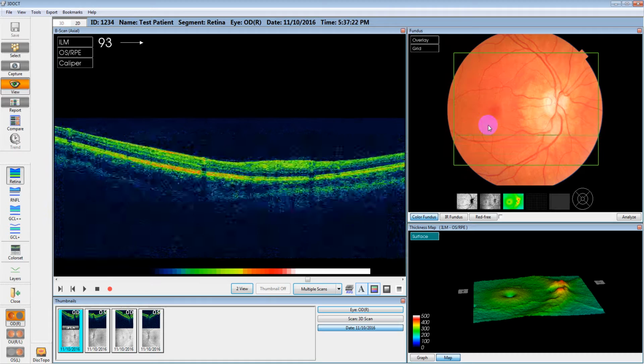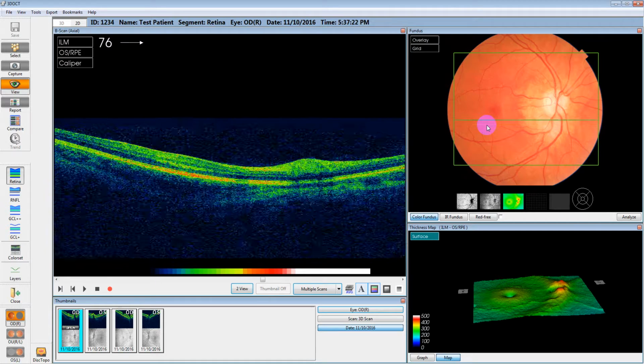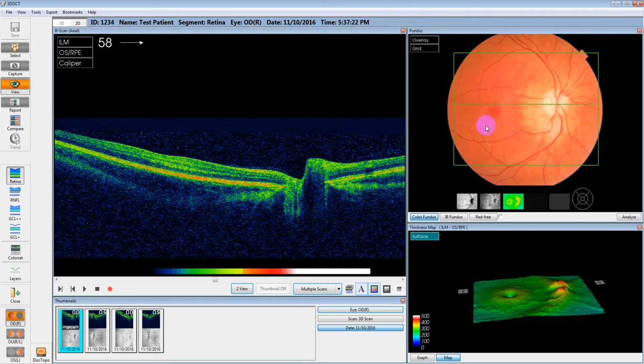Now, on this same screen, you have some options. Let me put this back in the middle. You have this filter here. These are filters, or grids, too. This one will highlight the blood vessels. That's a toggle on, toggle off. Next one, toggle on, toggle off. You can see it goes to overlay there. On, off, on, off.